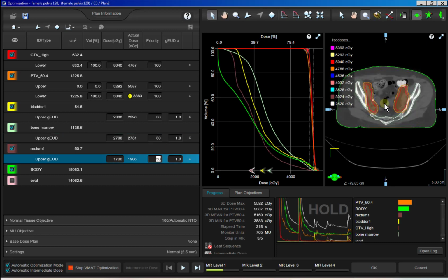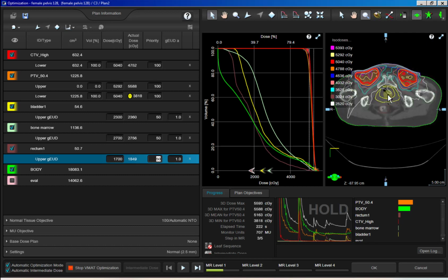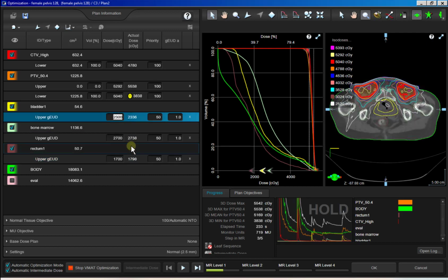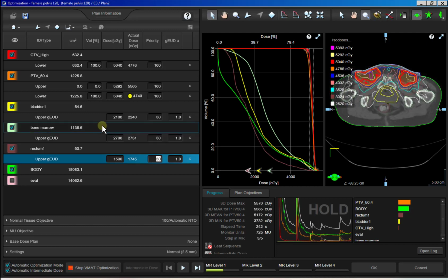Something that we really haven't done is, if you're looking at your dose distribution, and you start to see... well, let's first try to make it happen. So let me keep pushing on these for a little bit more before I bring up what I was going to bring up.